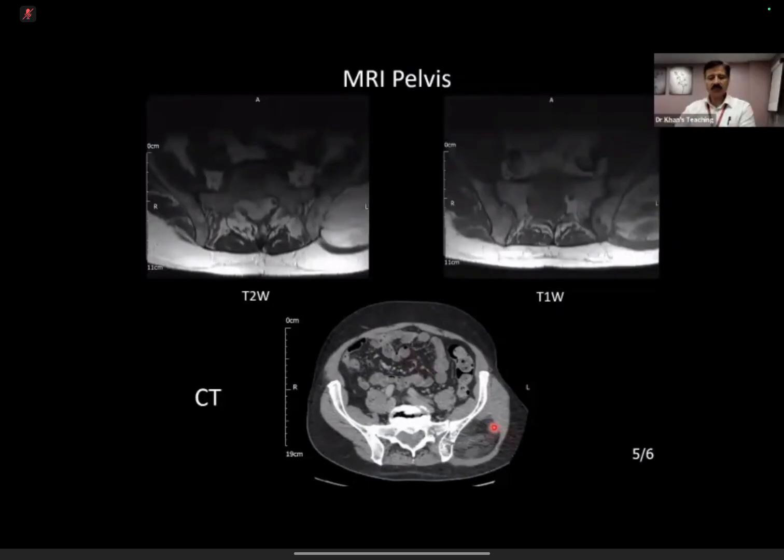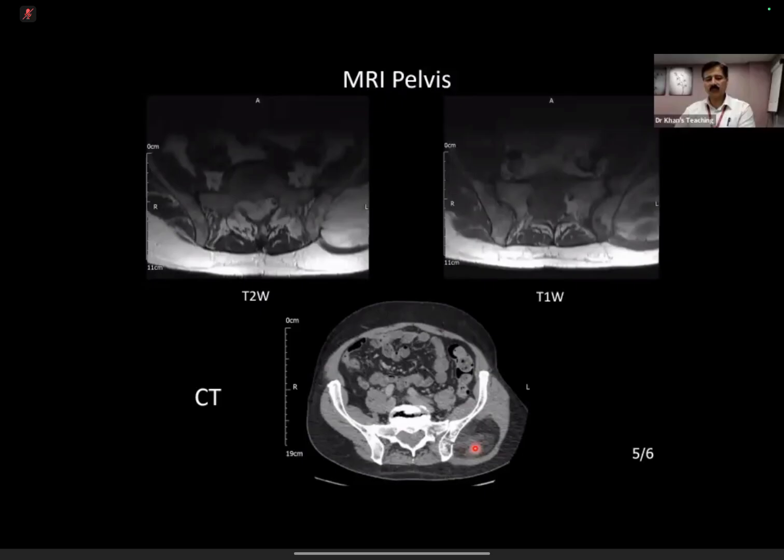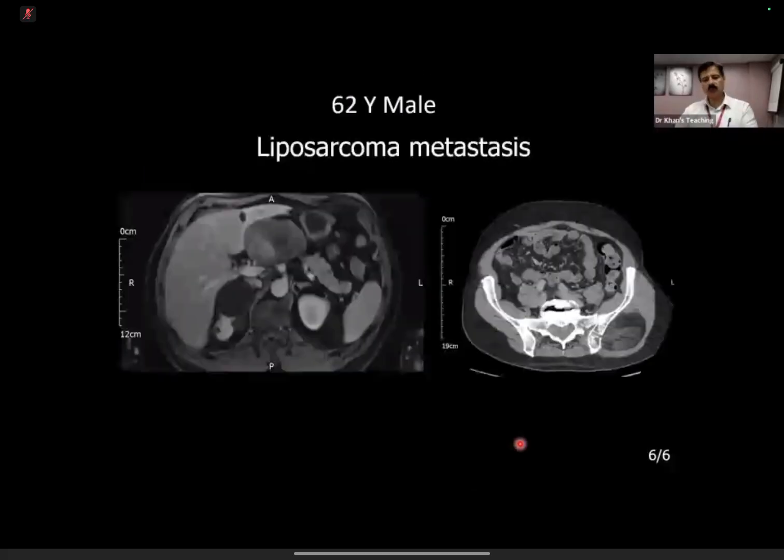This is on a CT scan, it becomes very impressive where it had fatty change just like this MR, and there was a liposarcoma sitting there, incidental. So this is a type of a long case. Of course, I did not show it to you as a long case, but I wanted you to keep an eye open for fat-containing lesions. And metastasis from liposarcoma in the liver have come in the exam. And this is the idea to show it to you. Liposarcoma metastasis.